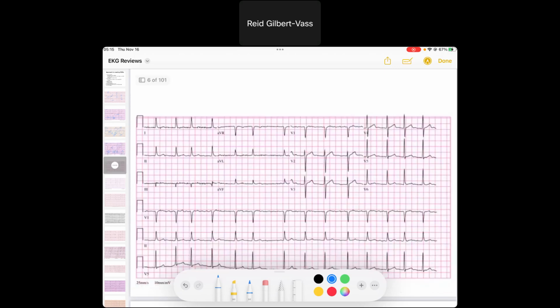Right. The next EKG, we're going to look at this rhythm strip here, and I've got a quick rhythm, but it's a pretty short interval compared to this, which is long, and then shorter, maybe a little longer. So it doesn't look very regular in a sense.